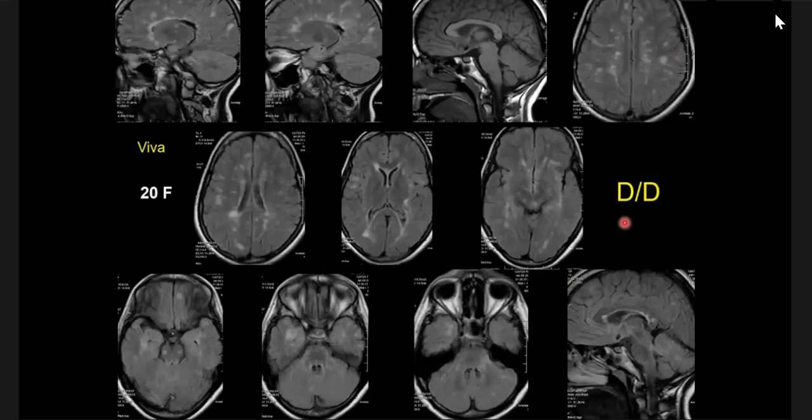Okay, so we have selected sagittal and axial images of the brain in T1 and FLAIR. There are abnormal foci of high FLAIR signal around the septocallosal region of the brain and in juxtacortical areas of the brain as well. They appear to be different sizes and different shapes. I can also see one in the right, or bilaterally, in the medulla oblongata on the image on the left.